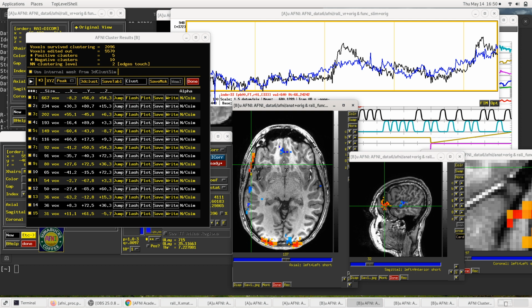What that likely is, maybe it's muscles along the temple area. We do things when we're concentrating on something, for example, when we may squint our eyes to focus on some image that we're seeing.